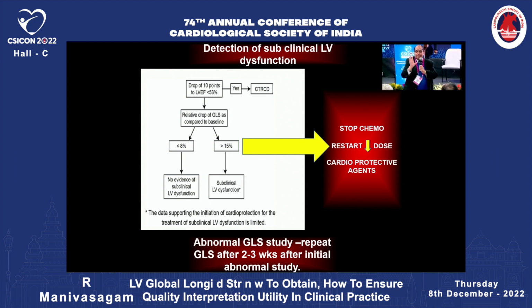Well, ejection fraction you can show them, no? You can see the ejection fraction is normal, and now the walls are not coming in together. So that's easy for us to make the oncologists believe that there is a change. But when you are looking at the global longitudinal strain, you really can't tell the difference, how much the base is moving towards the apex. Not very easy to see because the change is only 15 to 20%, very little change. So that's more difficult for the oncologist to believe. Most of us have a hard time making the oncologists change their therapy based only on the strain. So they would also like to look at ejection fraction.